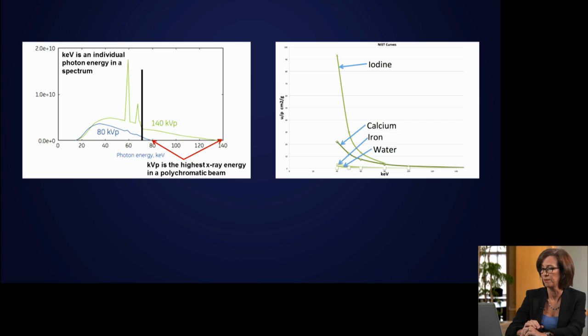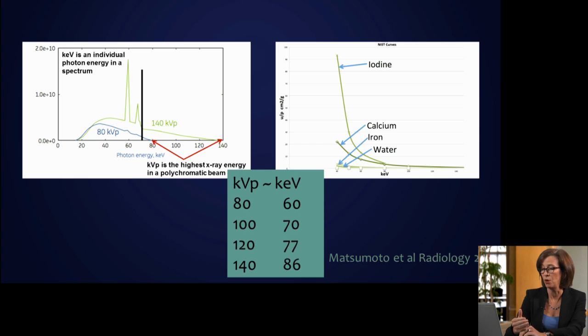And so when you're thinking about this for a patient, there have been phantom studies that have shown that basically 77 keV monoenergetic images are visually similar to 120 kVp, single energy CT image. Now in our clinical practice, we started looking at 77 keV images as our PACS equivalent, since most of our patients are studied with 120 kVp beams in a single energy mode.